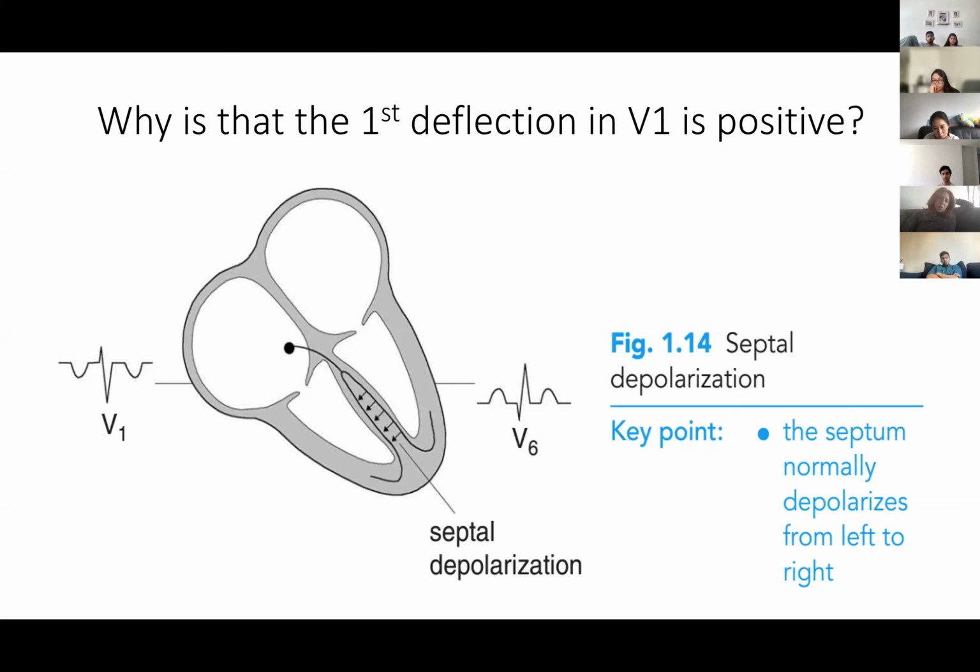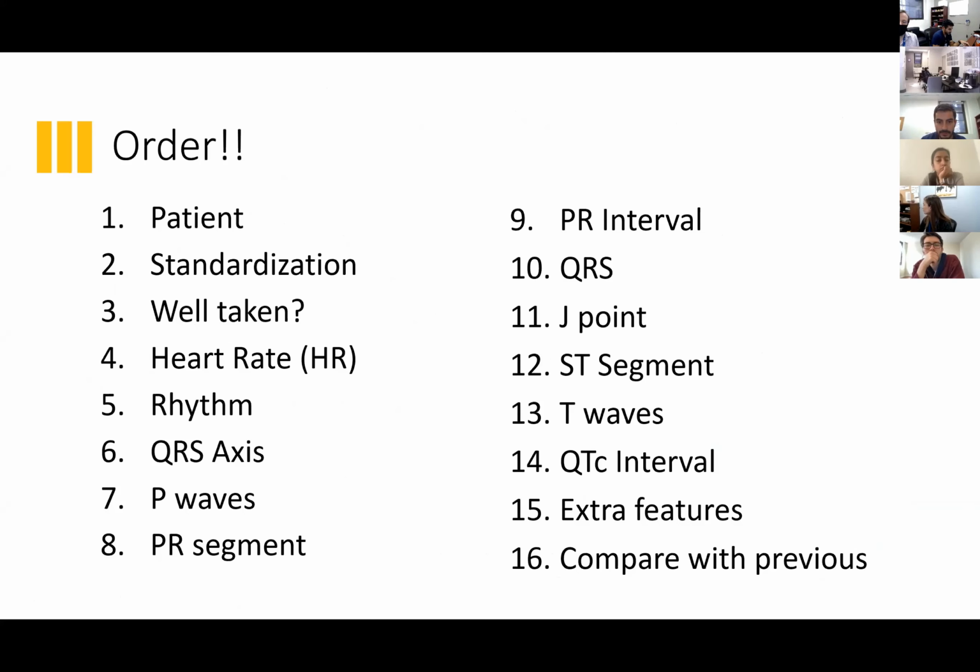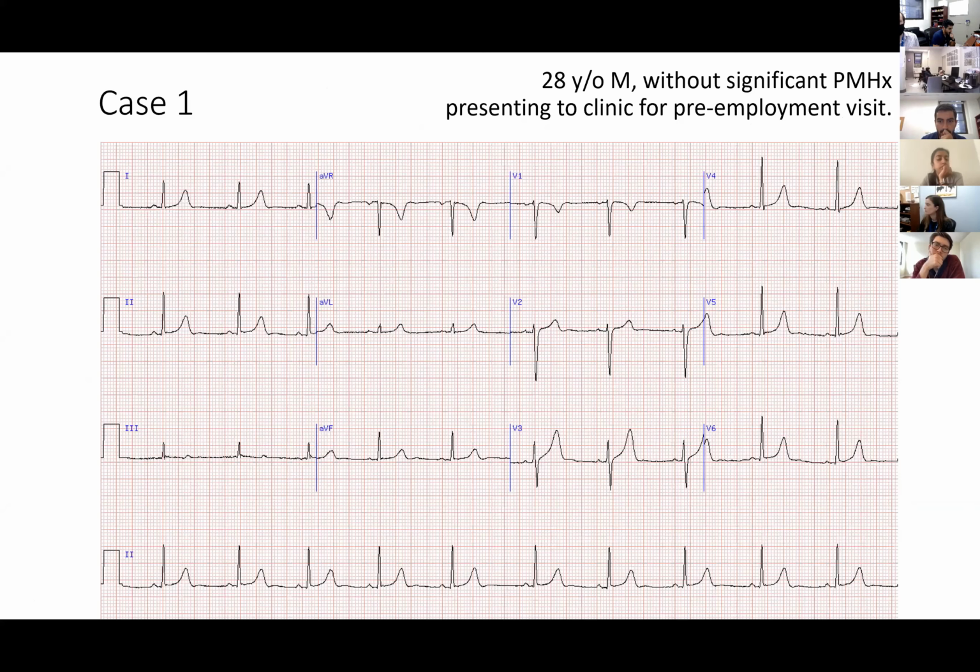Okay, so let's see here. So let's do a little bit of cases, and then we'll go back to the. We can also annotate here actually. So let's see. So in this first case, okay, I don't know if anyone wants to jump in, but trying to do the actual order that we were talking about.